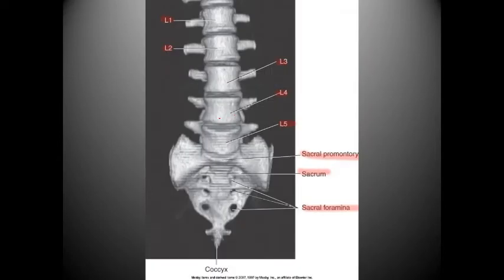So, as we know, 3D reconstruction has been called on in terms of looking at the spine. We start by labeling L5, L4, L3, L2, L1. Sometimes volume rendering is excellent, sometimes it is not. A lot of it is based on whether the patient has enough calcium in their bones to actually demonstrate excellent anatomy.